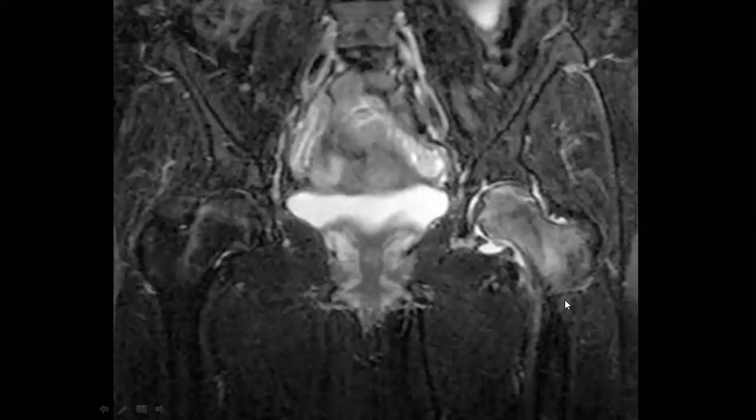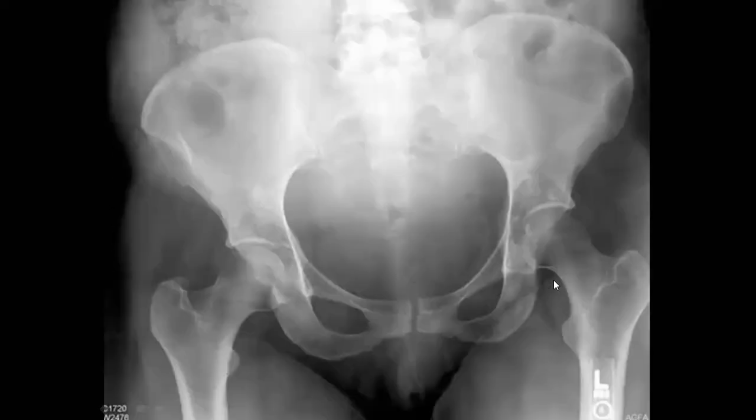Why? Maybe in the X-ray you don't find anything, or maybe you will mention some osteopenia here. Okay. And in the MRI, you can see clearly that there is, what is the description? What is the word that you should mark if you mention it? Nermin says, okay, unilateral, only involving the femoral head.